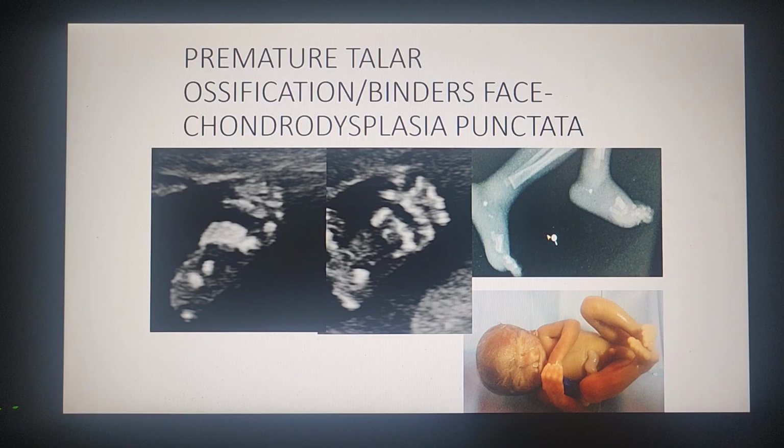So when you do your TIFA at around 18 weeks, normally the foot does not have the visibility of a calcaneal and a talar ossification. All we will see is a few metatarsals and phalanges, and the heel region will be usually soft tissues without any bony appearance.